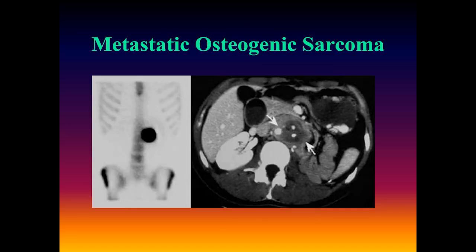This is a patient with metastatic osteogenic sarcoma. Notice the intense uptake in the metastatic deposit.